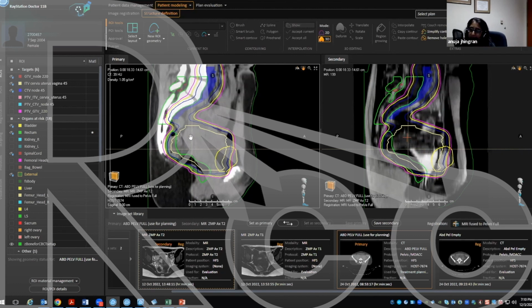What is the recommendation? If you see it like this, if you're going to do the brachytherapy, what is the recommendation? What should you do? I know it's not a contouring question, but I'm going to ask this because this is relevant anyway. And this is a real case, like the case I just showed you. We just did her on Friday, HDR.